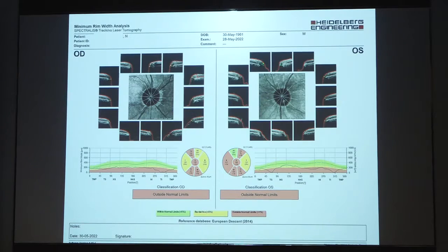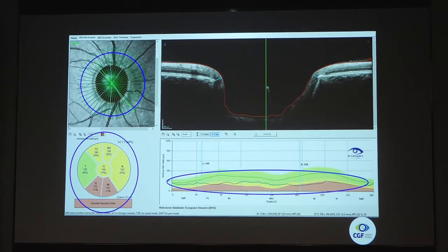How we look at that in a clinical way is that the printout comes like this. Most of us are used to the printouts, but what we do in our OPD is mostly look at the screen directly from the machine. That is the best way you can really see. But this is another way you can see the printouts, but we'll go step by step.